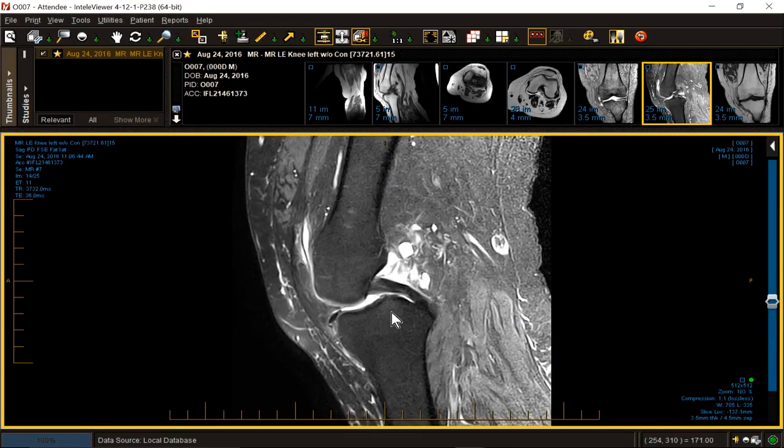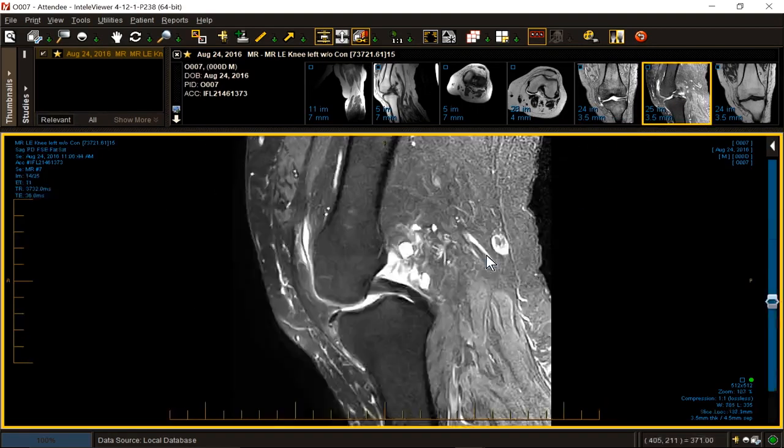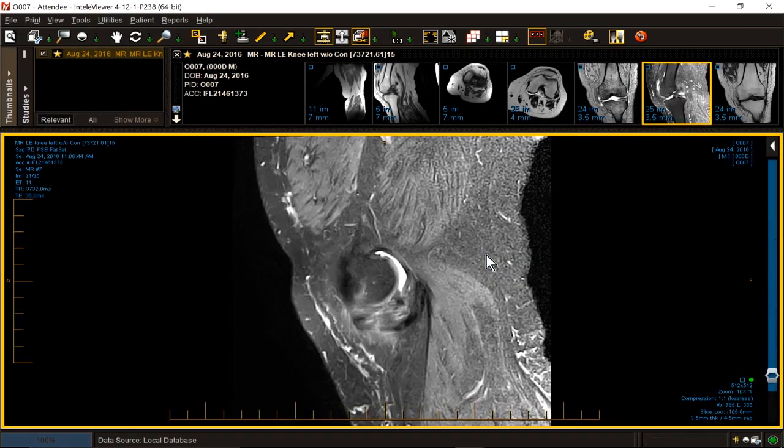For body tears, you're going to go with the coronal, and just about every adult is going to have a horizontal cleavage body tear after age 60. So don't get too excited about those unless you have a cyst or inflammatory reaction. The inflammatory reaction, as in this example, is critical to the correct answer. Because in every knee, there are 20 findings. And if you just sit there and rifle off 1 through 20, they will hate you.